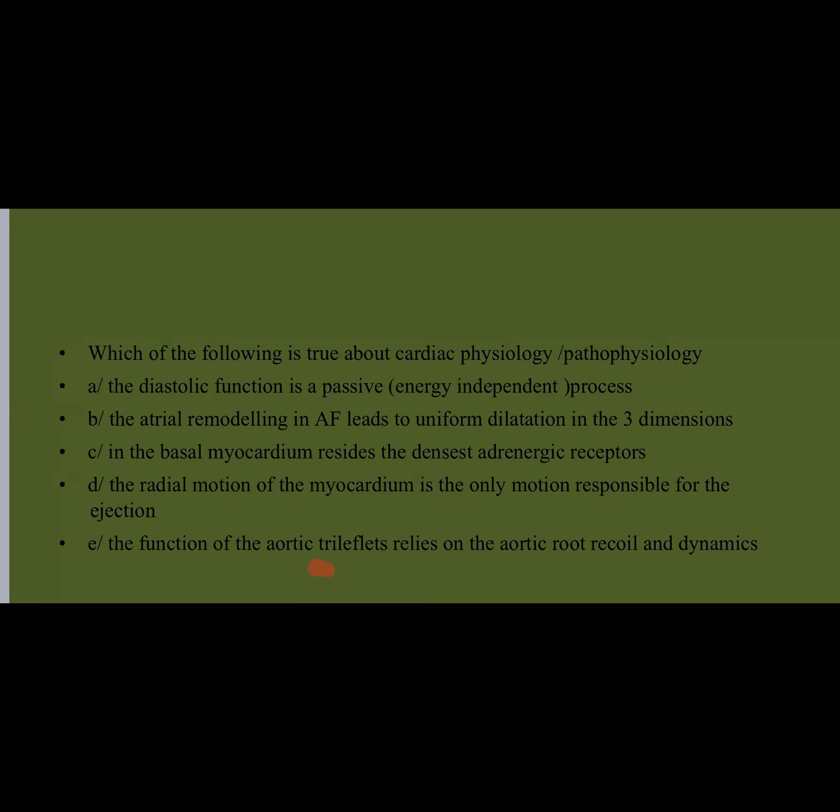Okay? So it is better to measure from the apical window, the anterior, the lateromedial or inferior posterior, inferior superior. Or better still, do the volume assessment as we said. Don't rely on a single measurement, because it is misleading. Now, what about C?